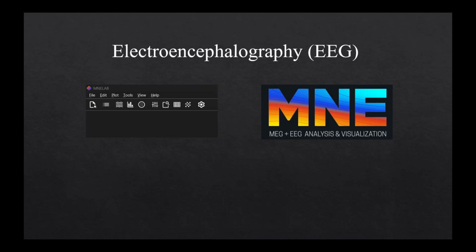Simultaneously, we will also see how we can do the same thing in MNE Python based coding. Actually both are the same, but the first one is GUI based, and this one is coding based. We will see how this works and how this works.